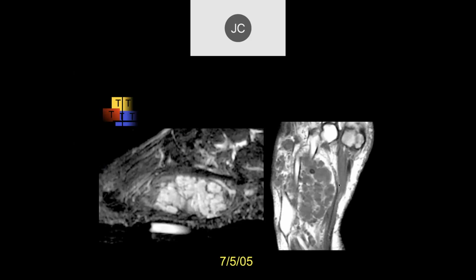Okay, on the plantar aspect of the forefoot, this multilobulated lesion is bright on STIR, and I think this is a T1. Very serpiginous, vessel-like. We're in the vascular section, so a malformation, I would think.